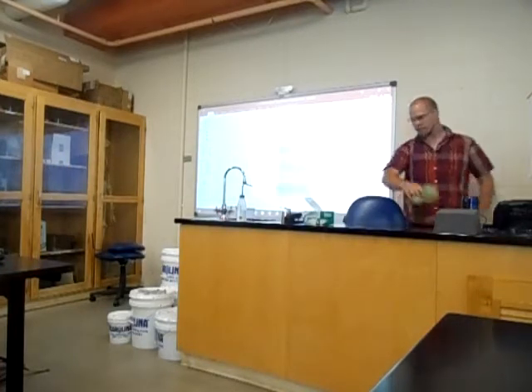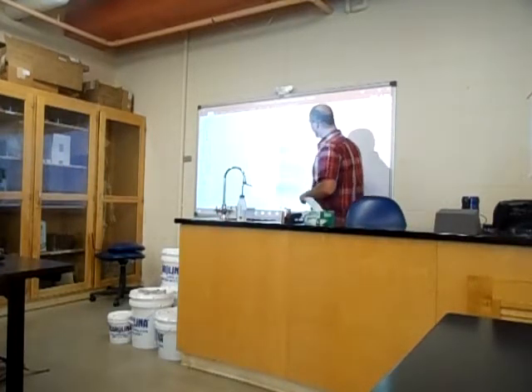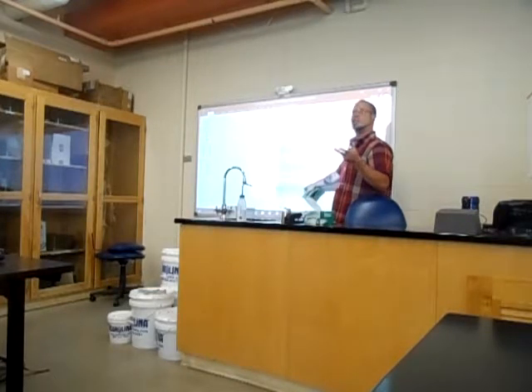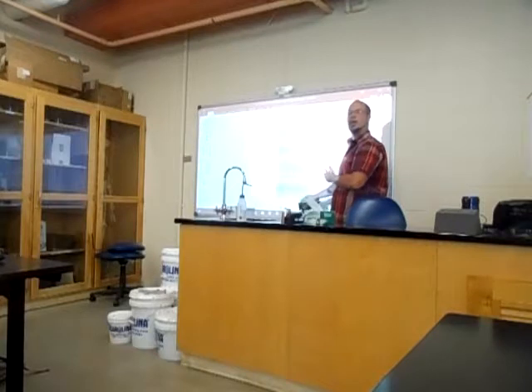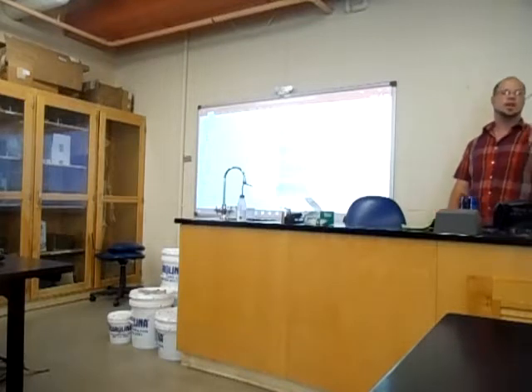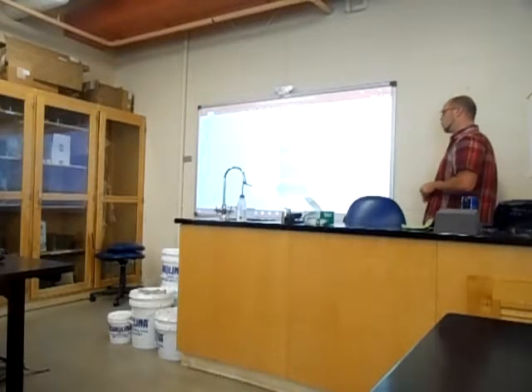And then down there at the bottom is ventricular fibrillation. No discernible anything. It's just going nuts. Okay? The electrical activity is unpredictable and incoherent, and you therefore have no contraction of the ventricular walls.